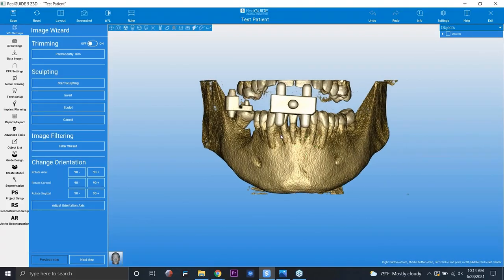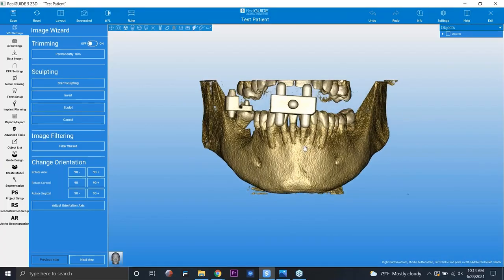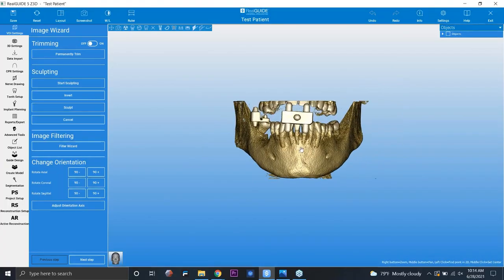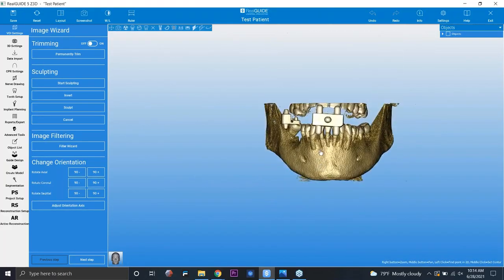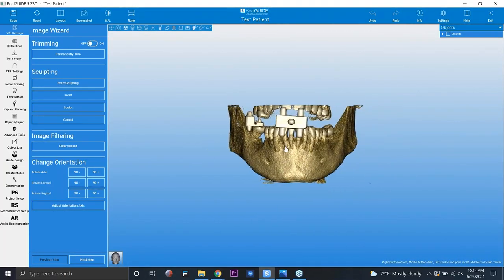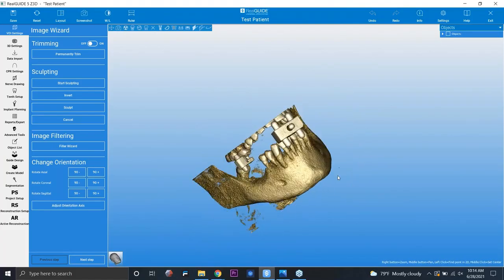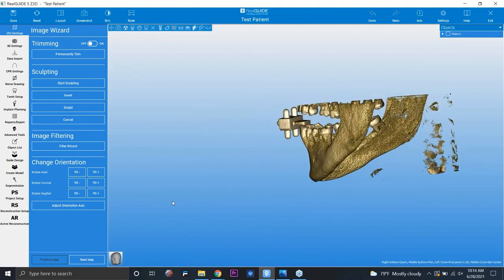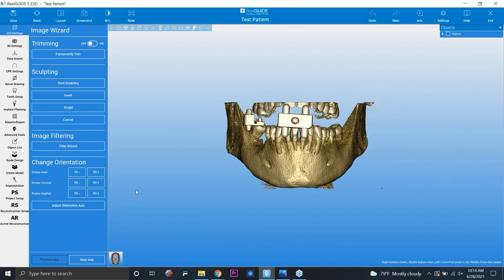And then lastly, the mouse wheel. You can scroll your mouse wheel, and that's another alternative to zooming in and out. But by actually clicking your mouse wheel, that's what allows you to bodily move your image in the XY axis as well. And then at any point, if you want to return to the default zoom and positioning, we can click this reset button to reset the views.